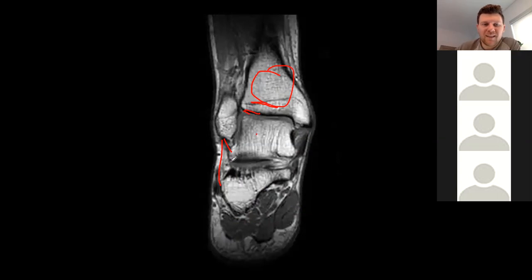What's right above cortical bone? Periosteum. Is there periosteum in a joint? No. It's cartilage. The cartilage. And then you can see on your talus cartilage, maybe a little bit of subchondral bone, and then cancellous bone. So you can see all the layers in the joint if you look in those certain areas.